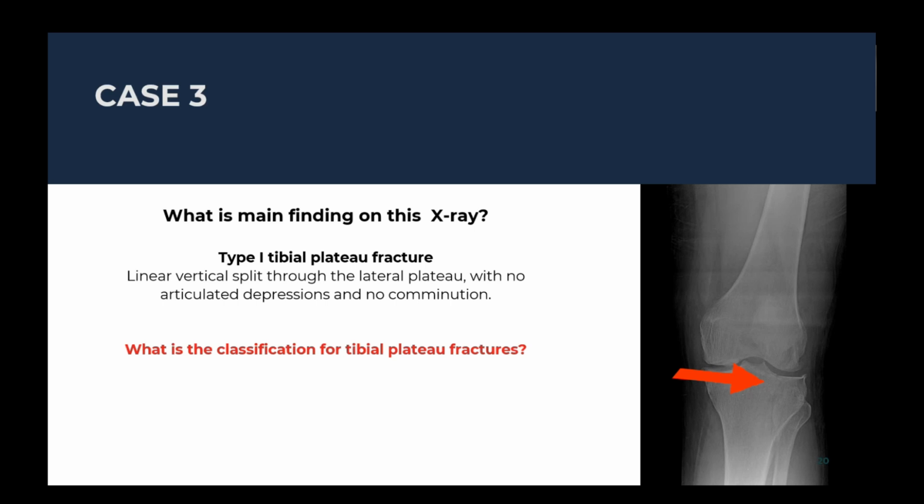Okay, so what is the classification for tibial plateau fractures? Okay, should we look at the answer? Okay.